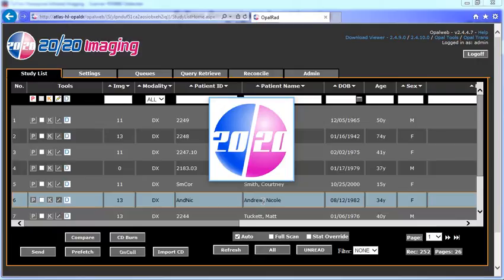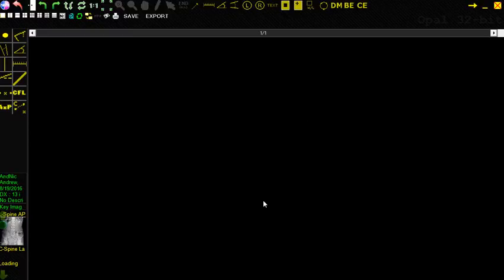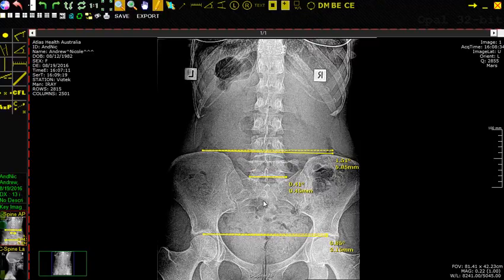But the point of what I was saying is you can zoom into this whole image as one unit. You can zoom out. And you can now do all of your annotations. You can flip to invert your whites and your blacks, no problem. And you can also then save it and put it on your own computer as one image. And then what you simply need is the Pocoscope or the 3D stereoscopic viewers. You don't need the view box, just the little glasses, and you can look at the screen and you will know exactly what you have to do.